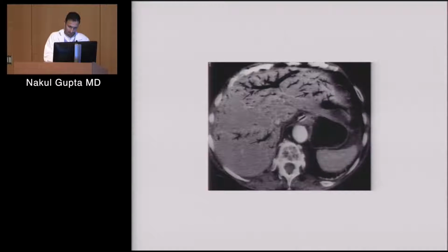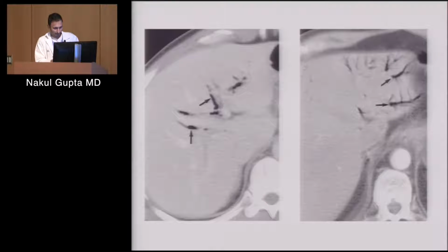So there we go. Here's another example. Now you'll see this mostly in the left lobe. Why is that? Because the left lobe is non-dependent. Remember, gas is going to rise, so it'll fill up the left lobe before it starts to work its way down.